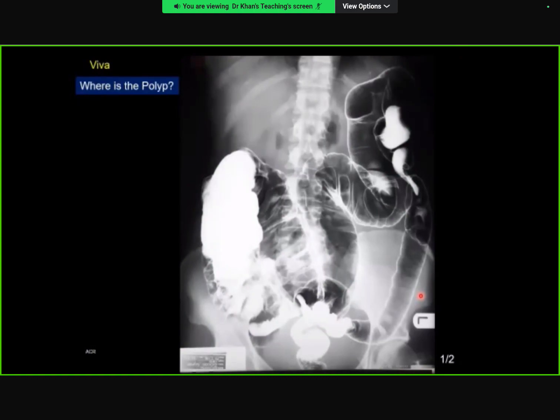I will show you another one if you raise the issue that it's in there. Yes, towards the right side, down. Yes, this is the polyp. Okay, can you name it? So is it in the descending colon? In the descending colon, low part, rectosigmoid, sigmoid low part.